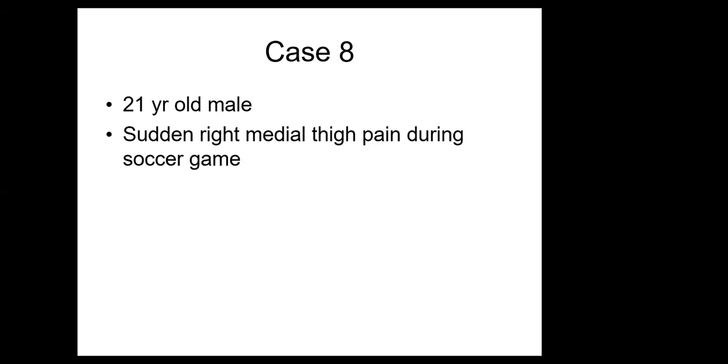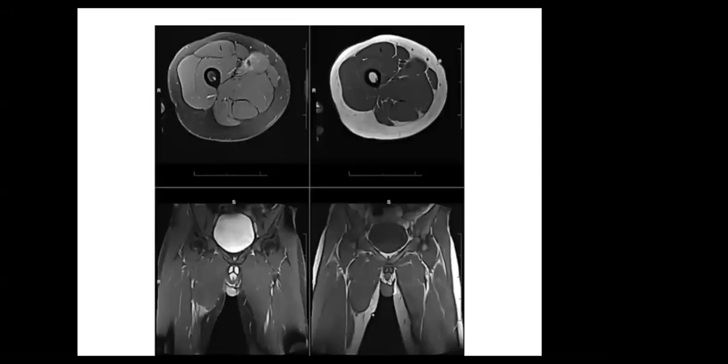Ready for the images? Yes, okay, ready. Right medial thigh pain. Correct, yeah.